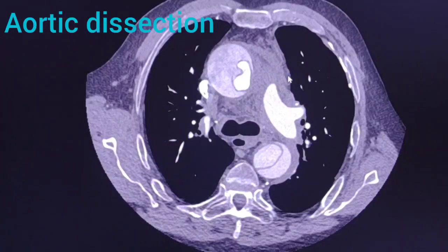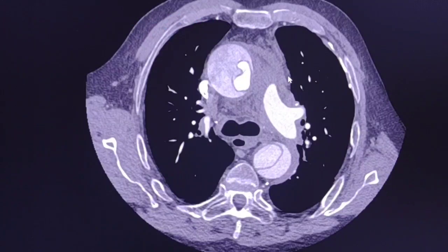Dear friends, hi. I have another interesting case. It's an acute aortic dissection, which is quite extensive, and I would like to discuss it with you.